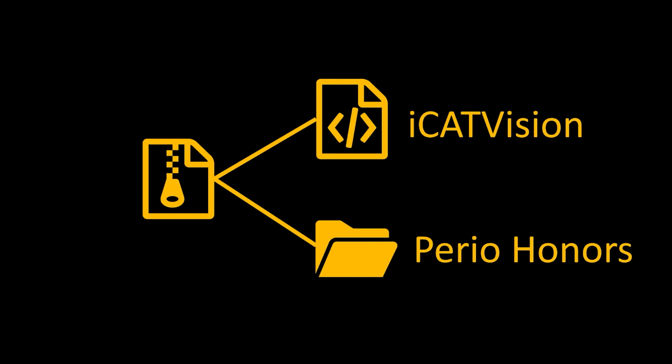If you are enrolled in the Periodontics Honors course, you will receive a zipped folder. If you are a D3 student and want to have the software and the DICOM file, just send me an email. I'll send you a link to download the files. In this zipped folder, there are two files. One is the iCATVision software, and the other is the Perio Honors CBCT DICOM folder.